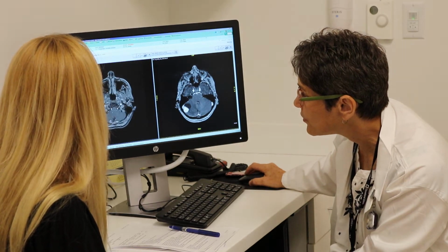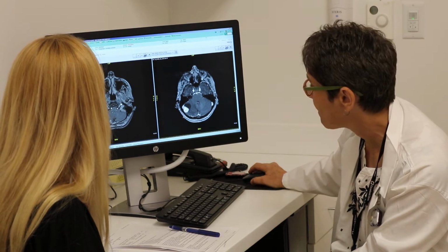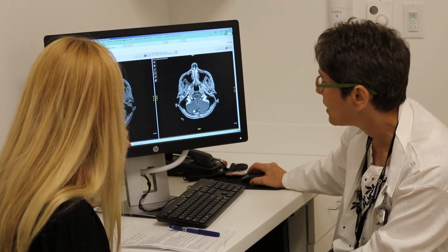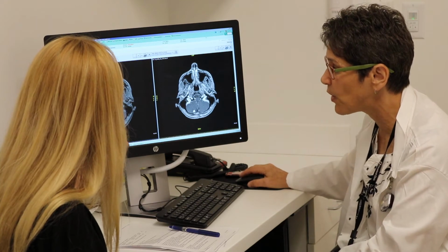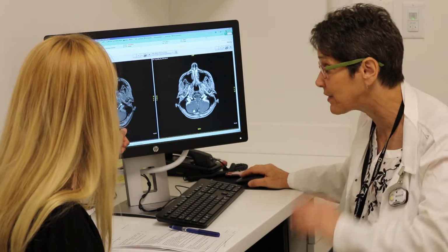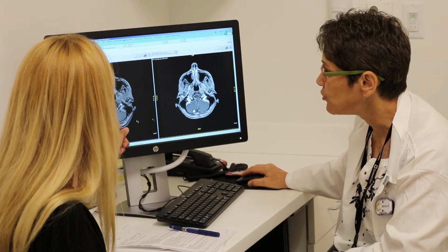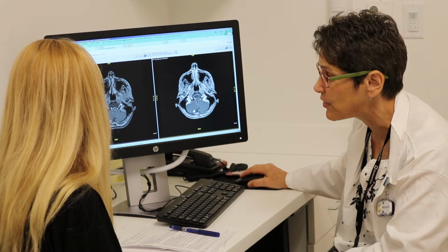this is the posterior area. That's where I had surgery in 2001, right there. Correct, yeah. It was on the right, this is the entry point. He did the suboccipital, your incision's back. It was a little bit more off to the right, the tumor that he resected was to the right. But you're absolutely right, you do see some post-surgical changes in there.